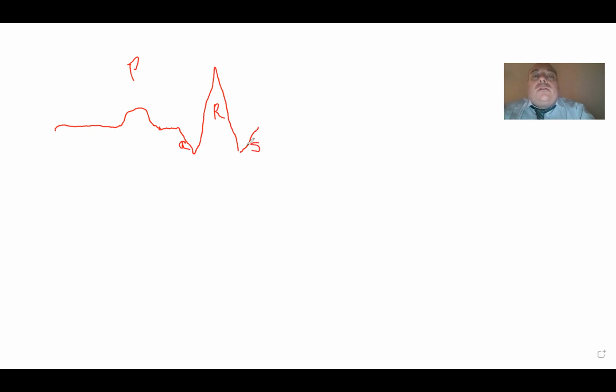Where the QRS ends or terminates, wherever that end point is, in this case, if this kept going here.